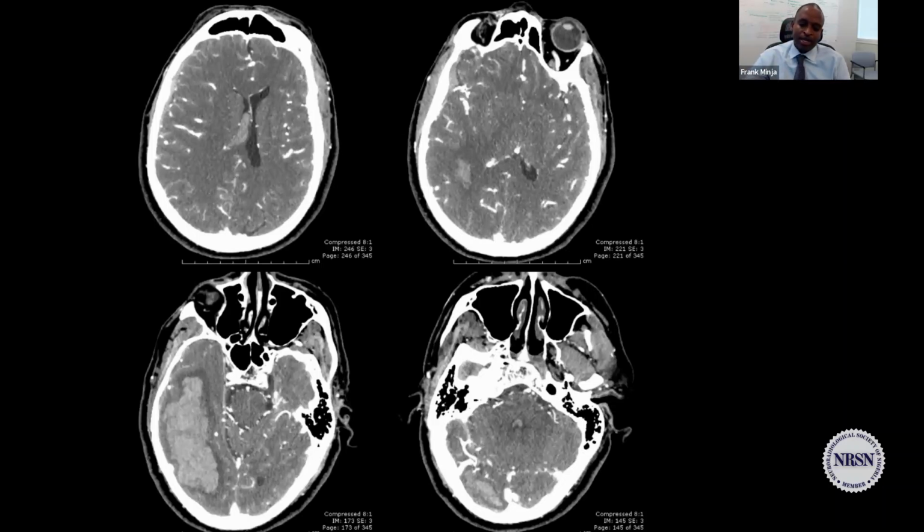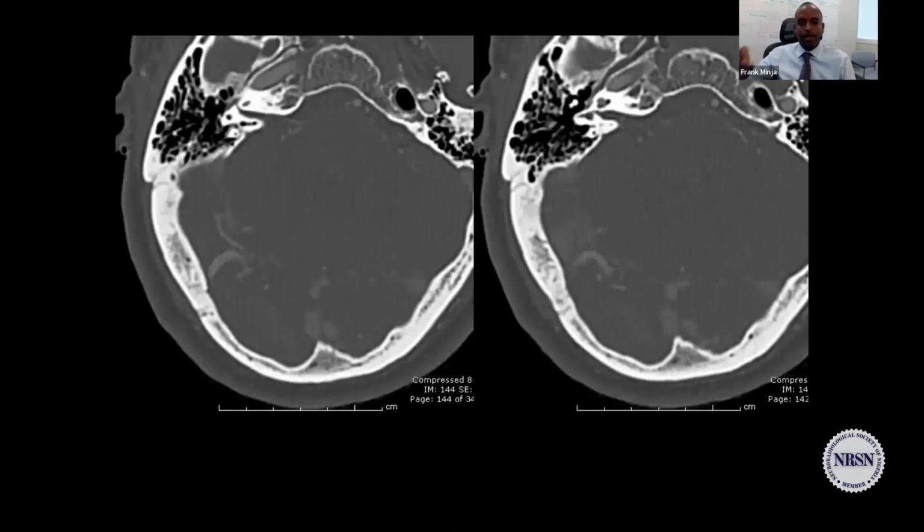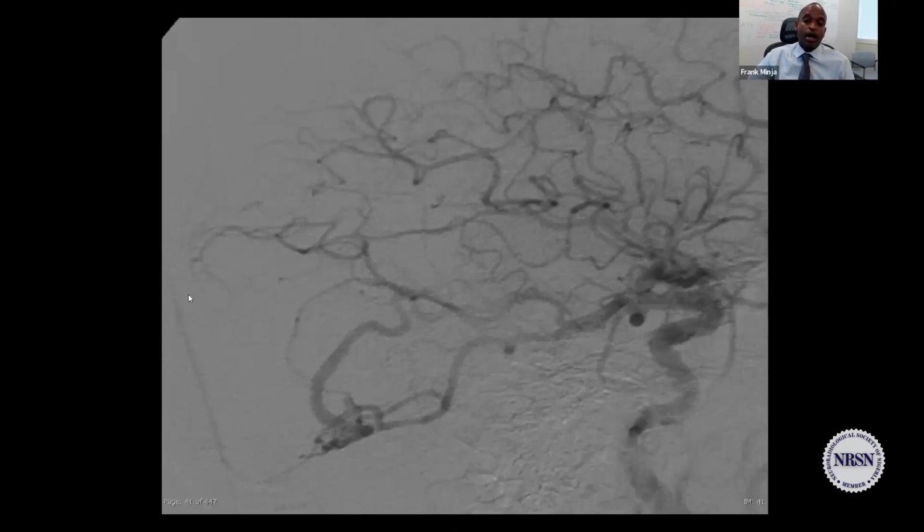Because these vascular niduses are very fragile, right? It doesn't have to be big. When you have a big one, you're very lucky, but often they're small little things that can cause a lot of trouble. So this small little maybe 1 centimeter thing caused a 10 centimeter hematoma that would easily kill that patient.